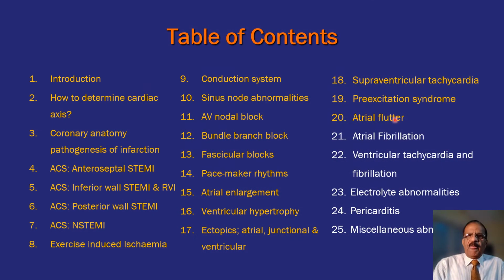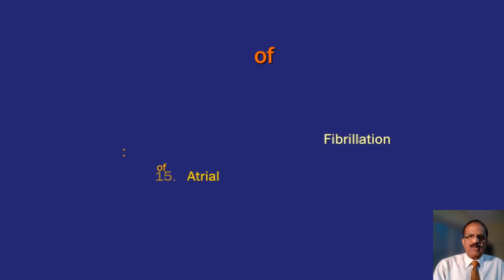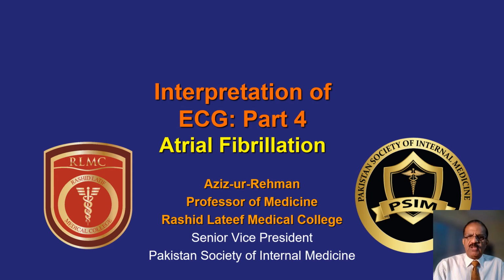This arrhythmia is much commoner than atrial flutter, and you need to learn this even more. We have covered atrial flutter and today atrial fibrillation. This is again going to be a short video because we have already discussed basic concepts. So today I'm going to just focus on the fibrillation.